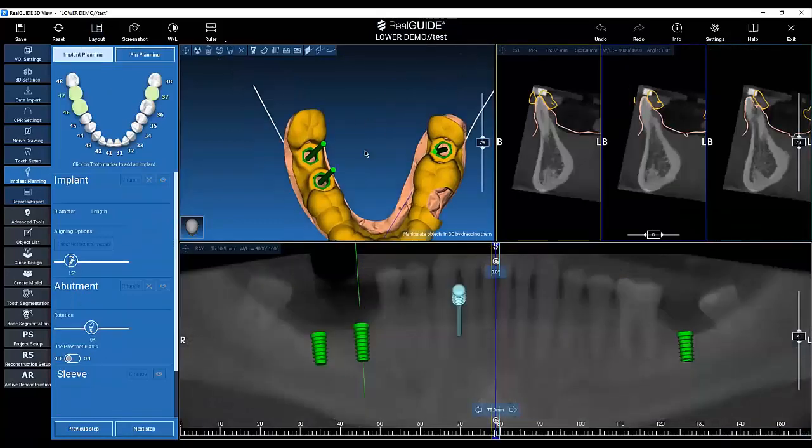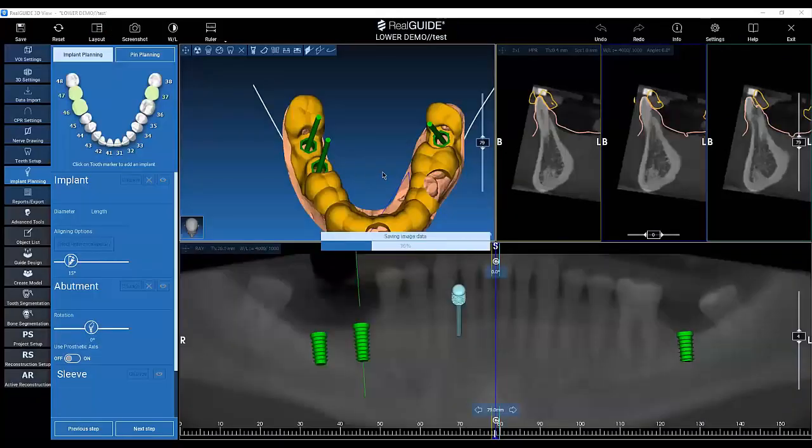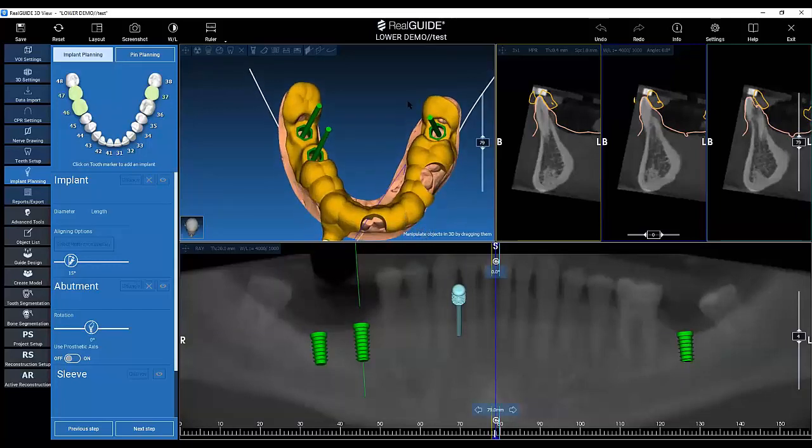Okay, I think I finished with this panoramic of the software. I don't know if Luca can tell me there are some questions and if I can answer. Okay, some people asked if we can see how to manage post-extraction guide. Yes. So if you wanted to show us how to delete a tooth, yes, and then modify the STL of the anatomy, yes. And then you go on STL modification, then if you show us also the Boolean operation we can do with the STL file.